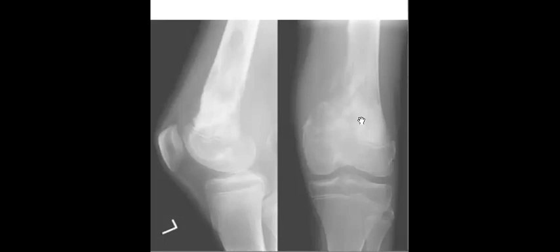Yes. Osteosarcoma. Osteosarcoma will be the top of your differential. Perfect. So it is aggressive, mainly lytic, and you can see some sclerosis here. So mixed. The differential will be Ewing sarcoma, osteomyelitis, you can put it, and maybe eosinophilic granuloma or Langerhans, maybe, but not more likely.